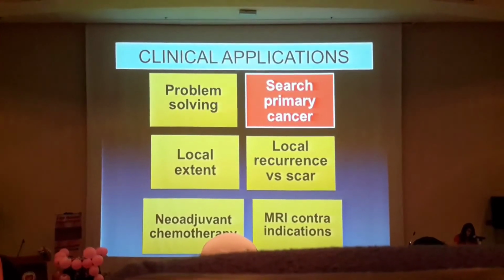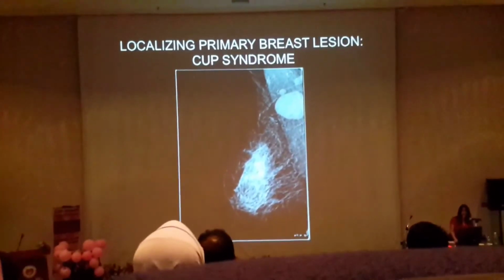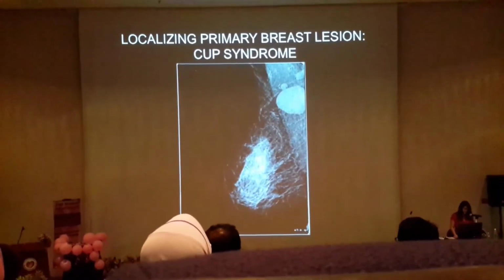In search of a primary cancer, these are patients who are referred to us for lymph nodes in the axilla, and they can't seem to find where the lesion is.